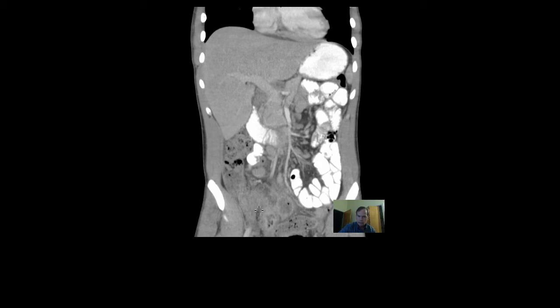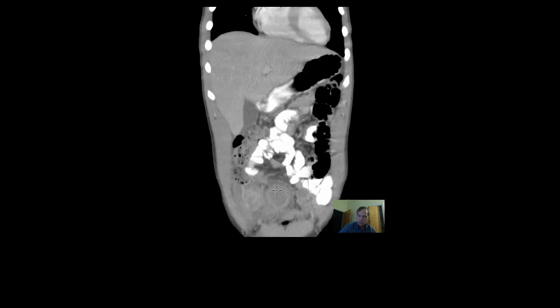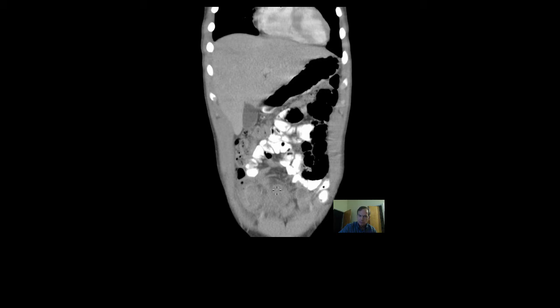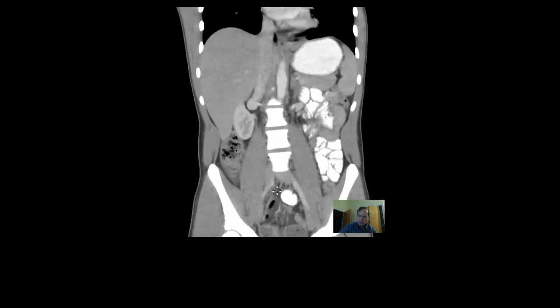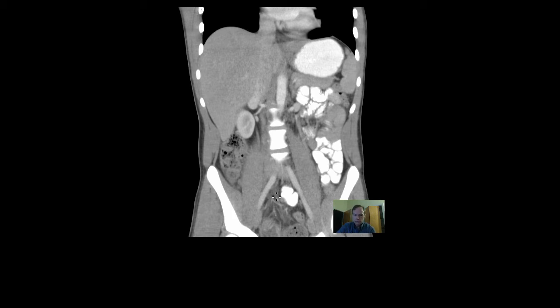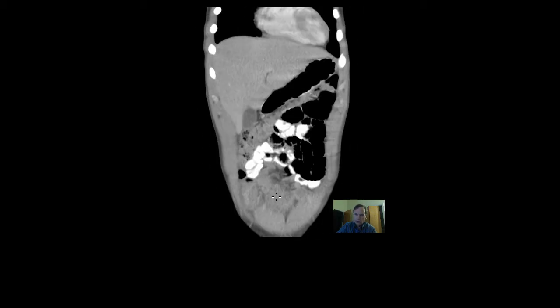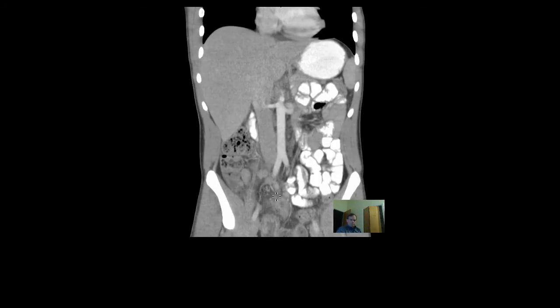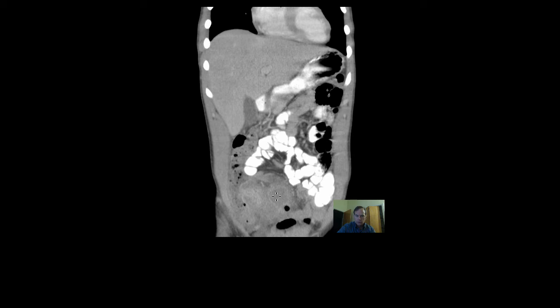So this is a rip-roaring case of Crohn's disease with considerable inflammatory changes in the right lower quadrant, with these small fluid collections that do not clearly appear to be part and parcel of adjacent bowel, and so I think these could be small abscesses due to fistulas.